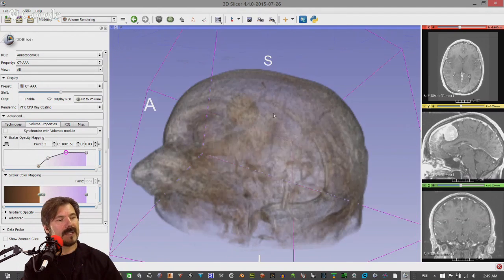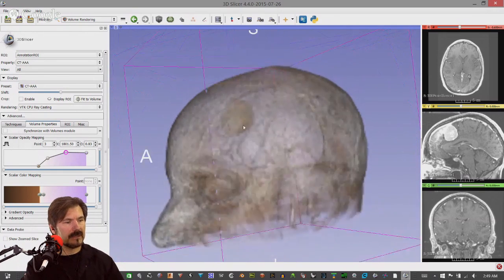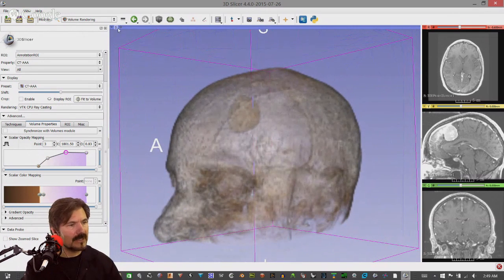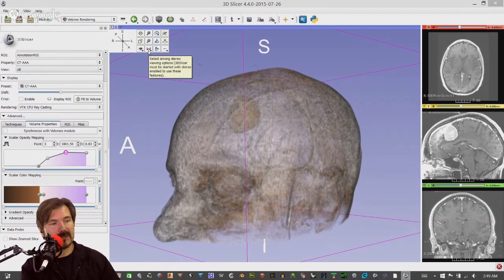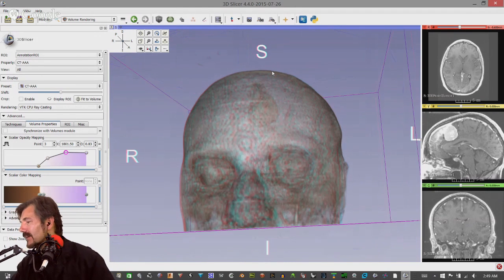So I found that you really have to tweak it a lot. I actually have too much. It's kind of bogged. There is a couple of things that I'd like to share before we continue. Let's see where we can find that. In the windows itself, if you pull in the left-hand corner, you have different options. And one of them is if you have anaglyph glasses or if you have a 3D monitor, you can choose to look at it in anaglyph. So if you've got anaglyph glasses, there you go. You can watch it. Hey, in fact, I do. Here we go. Hang on.